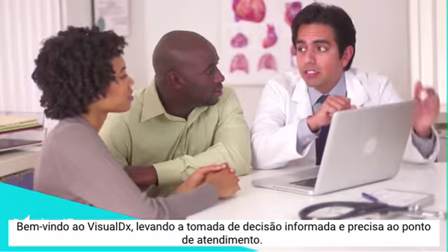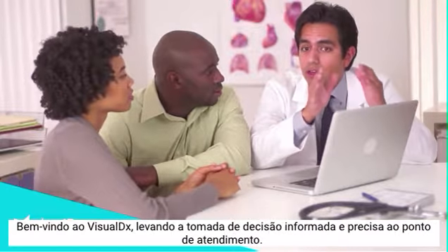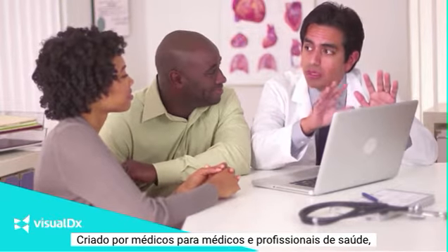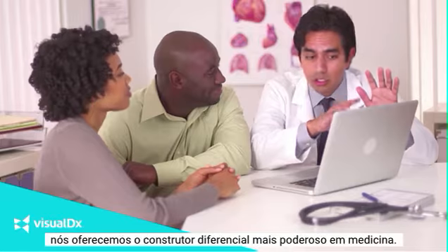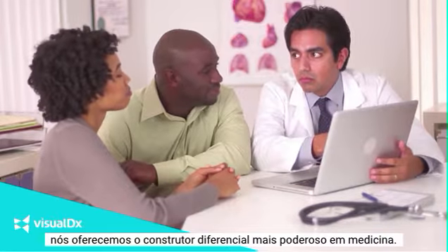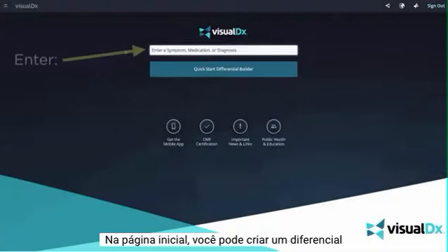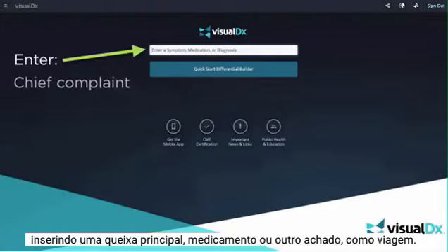Welcome to VisualDx, bringing accurate, informed decision-making to the point of care. Built by doctors, for doctors and healthcare professionals, we offer the most powerful differential builder in medicine. From the homepage, you can build a differential by entering a chief complaint, medication, or other findings such as travel.